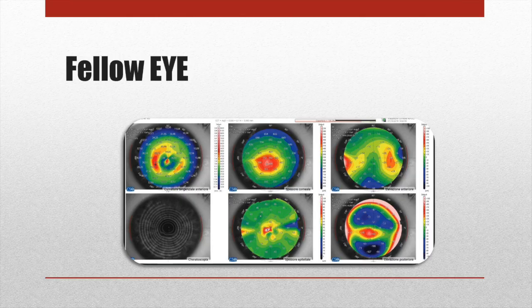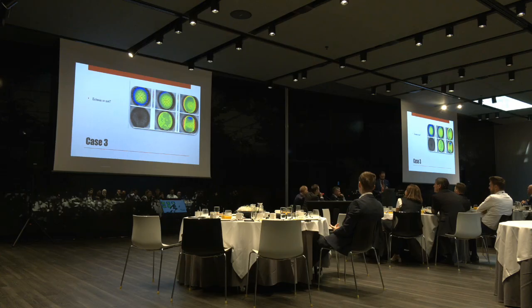So these are very advanced keratoconus, in which you know that sometimes you get a thick epithelium when it's super, super advanced on the cone. So this other eye went to surgery. This is a suspicious eye in which we can show that the epithelium was able to show some mild abnormalities. But again, I always want to show you that the posterior elevation is where the epithelium is thin. So there is no way you have a change in the epithelium and the posterior elevation is absolutely normal, because it has to change. The epithelium doesn't change alone. It changes after the stroma.